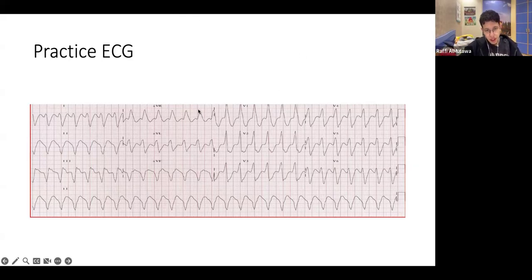Okay. You guys are correct. They said the arrhythmia, it is correct. But what told you that it was this arrhythmia? How did you know? Exactly. You looked at the QRS. Monkey sees, monkey does. The monkey saw the QRS. The monkey knows that there's a problem with the ventricles because the QRS looked weird. So even if you said, for example, that there was a problem with the ventricles, if that's all you knew, you are on the right track, 100%.